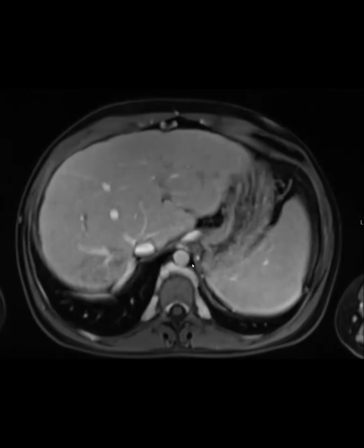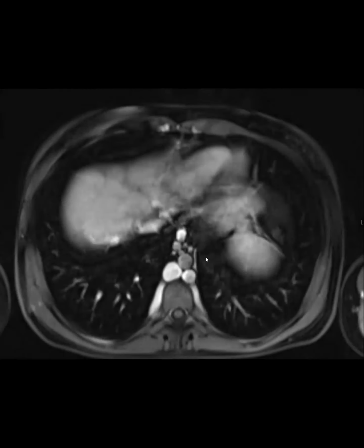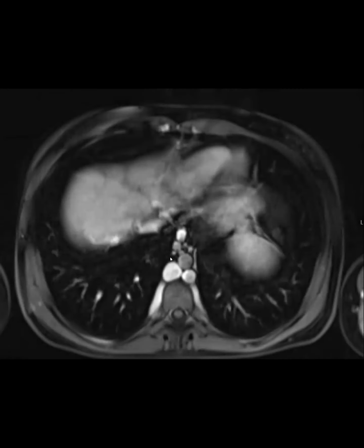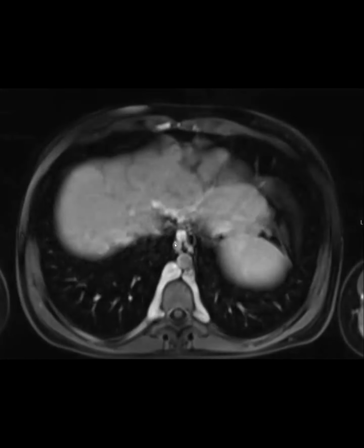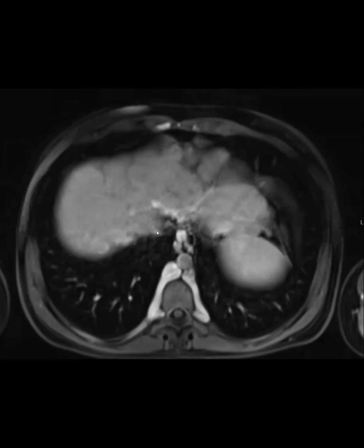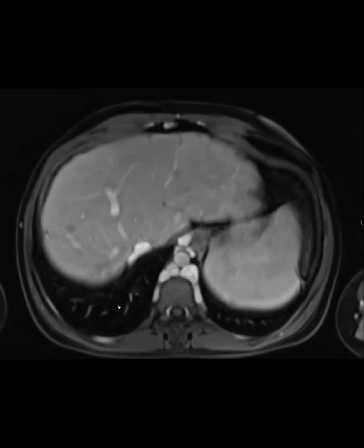And then Nelly said, where are the left, middle, and right hepatic veins? And if you'll notice, they don't come together to a normal IVC. Yeah, you're missing the upper intrahepatic segment of the IVC. Is this the Abernathy malformation? No, Abernathy is a malformation of the portal vein. This is basically a Chiari spectrum, where you don't have the upper part of the intrahepatic IVC.